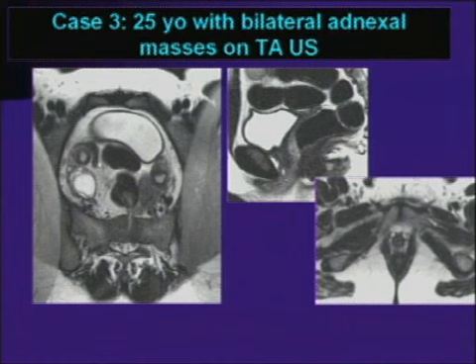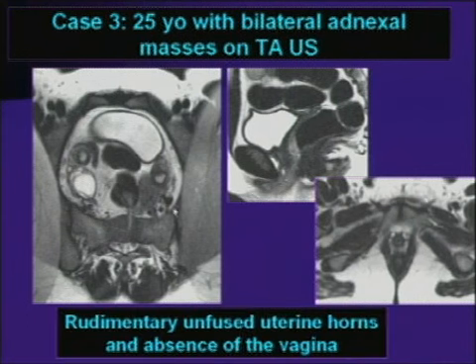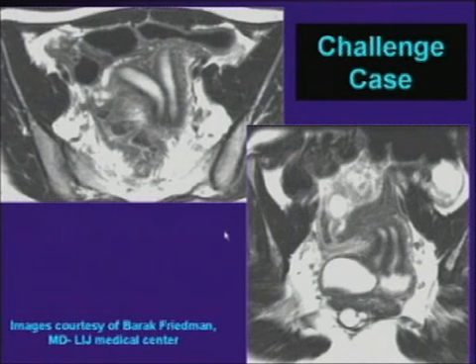However, we can go a little bit further and look at the adnexa and note that there are two small rudimentary horns in the broad ligament region. These are actually just unfused rudimentary horns, a very unusual variant, but very easily depicted at MR and very quickly seen.